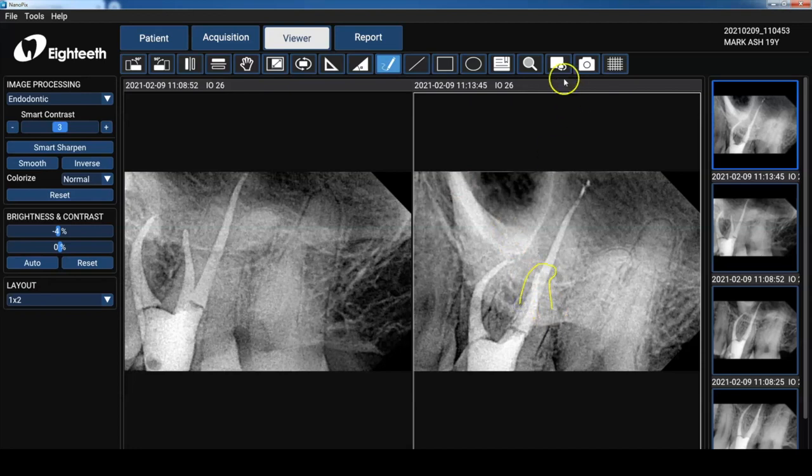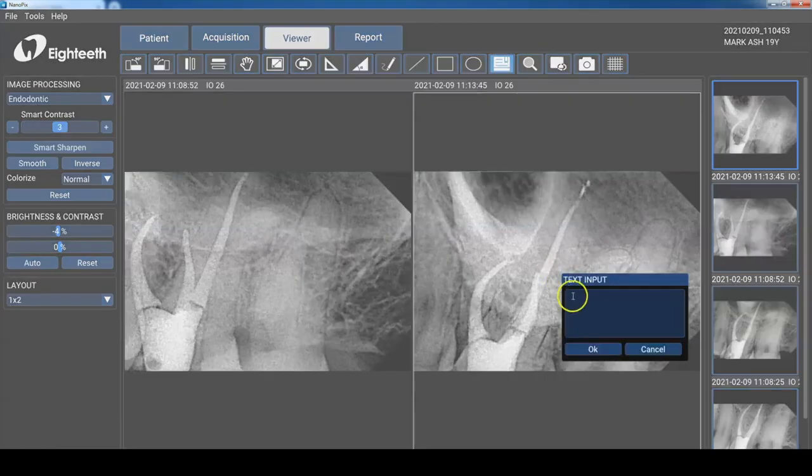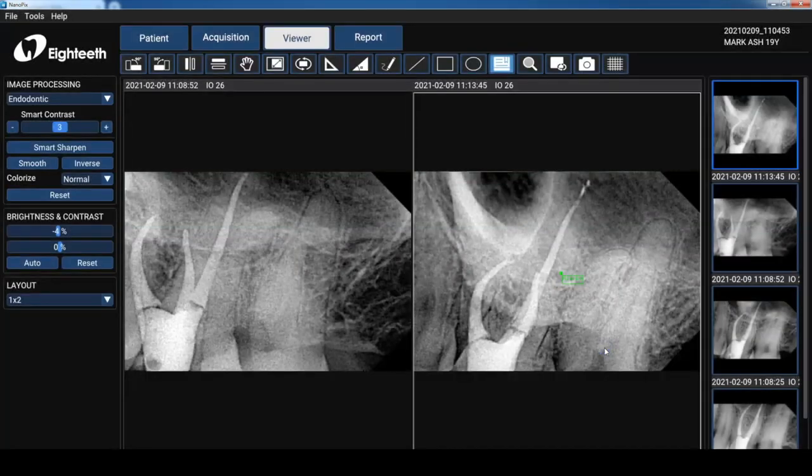And if you want to remove that drawing, you just click clear overlays. You can place a rectangle, ellipse, drawing. And one of the other tools you can use is just placing notes. So place a memo onto the image just to place some notes. I'm going to put in, we're going to follow up in 6 months. So we can clear that off or leave it.